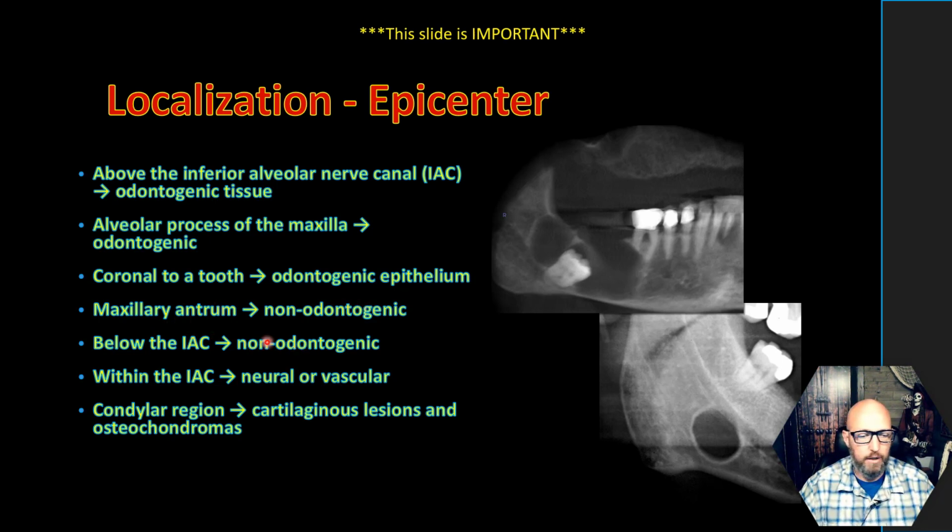Below the canal, I mentioned on the last slide as well. Like this, is this above or below the canal? That's below the canal. So you shouldn't even have OKC or ameloblastoma on your differential. Those are odontogenic lesions. This is a Stafne defect, which I'll show you again.